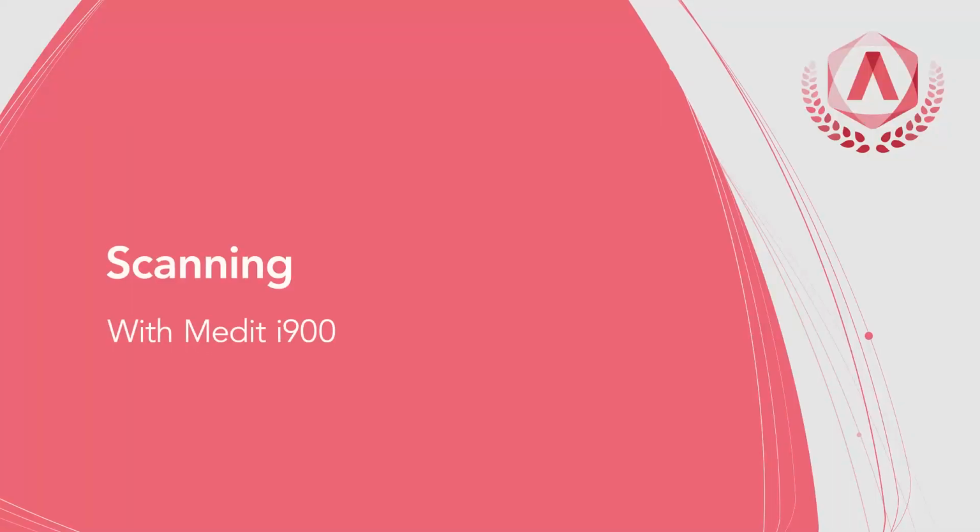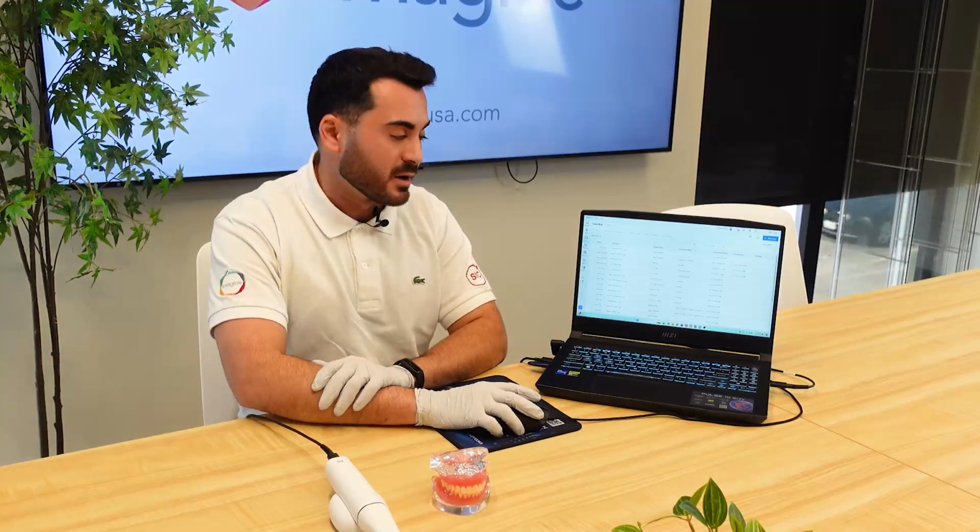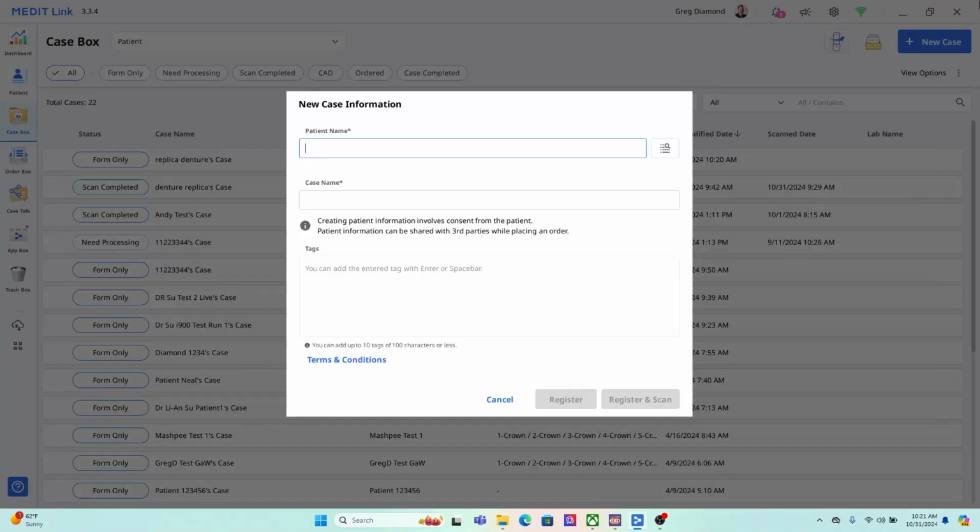All right, let's go ahead and start by first selecting New Case in the upper right-hand corner. Here we're going to want to put in our patient name. In this case, I'm just going to be doing Replica Denture. Then we're going to go ahead and select Register and Scan.